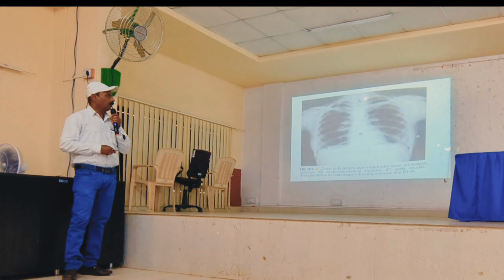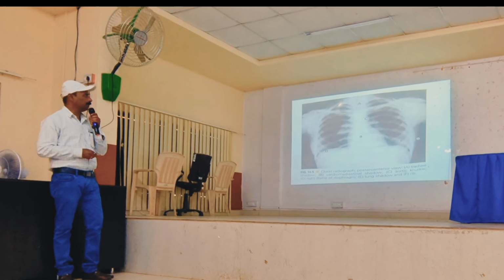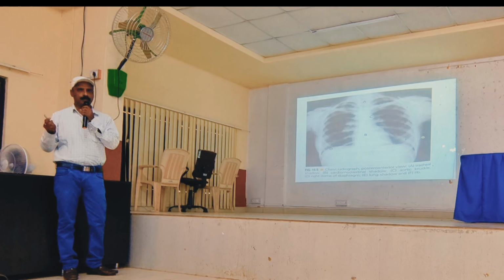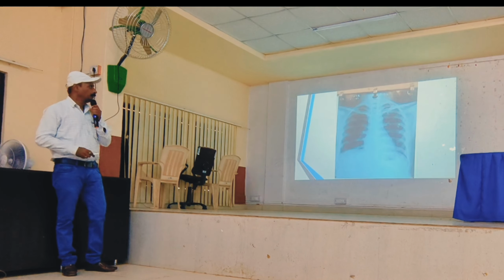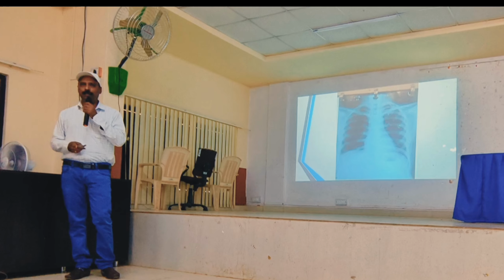So as these all parts highlighted, PA chest, most important, what you have to see, all these areas I have explained you. So you can read better PA chest and see what is the normal and abnormal. So this is the one view which is commonly kept for the exam. Then you have to how you are going to comment on this.